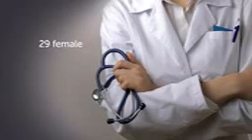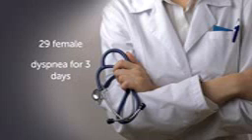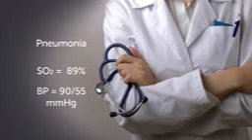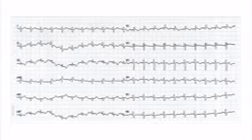So, a 29-year-old female who has dyspnea for 3 days and fever. She's diagnosed with pneumonia. Her oxygen saturation is 89% and blood pressure is 90 over 55 millimeters of mercury. She's brought to the hospital, and here her ECG shows these T waves, which are inverted and flat in V2 and V3 as a sign of right ventricular strain.